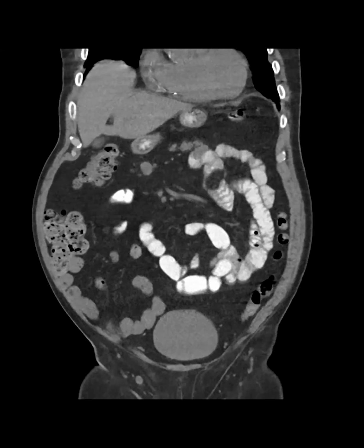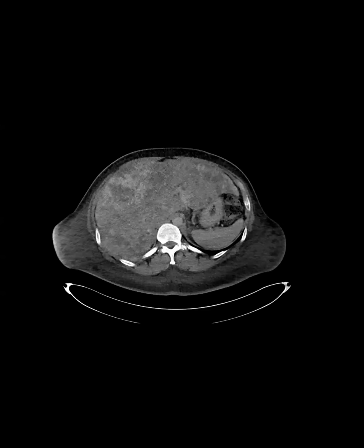So stay vigilant despite this contrast shortage. And especially, I feel like with a lot of colon cancers, I see the node first. That's true. Even the cecal ones, the nodes draw your attention.